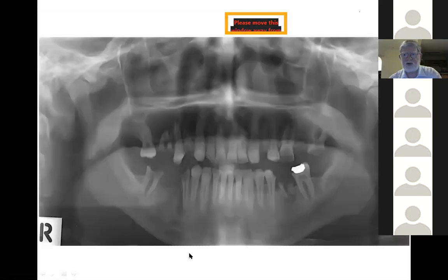Lots and lots of infection there. You've got a large periapical lesion there, almost cystic in size. Large periapical lesion bordering on a granuloma. If you compare that, it appears you're starting to get quite a deformed lining across there, and this is when you start to think, okay, maybe this is now cystic in nature.